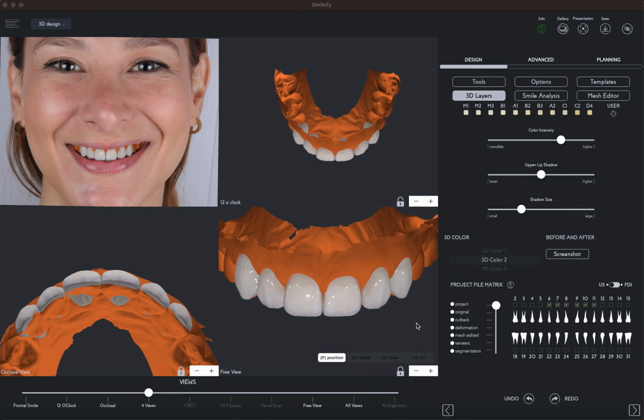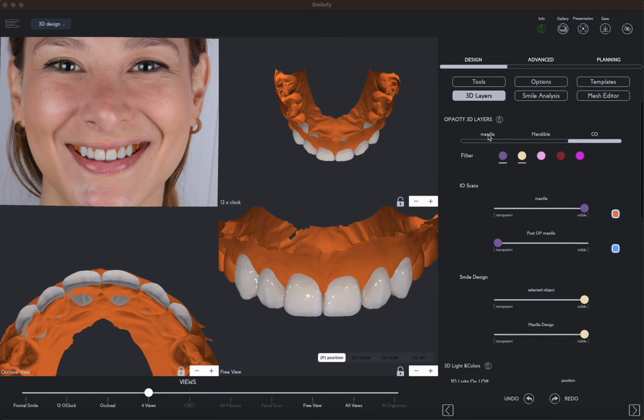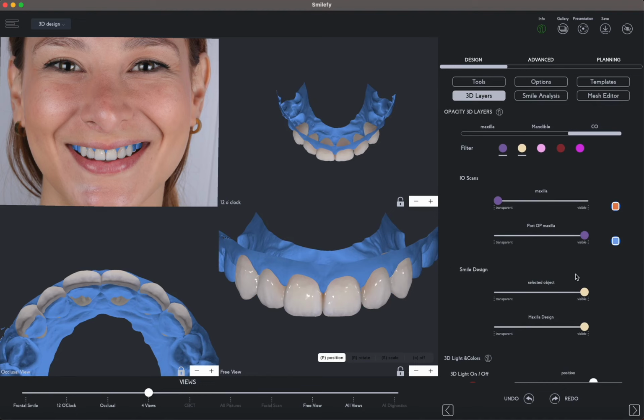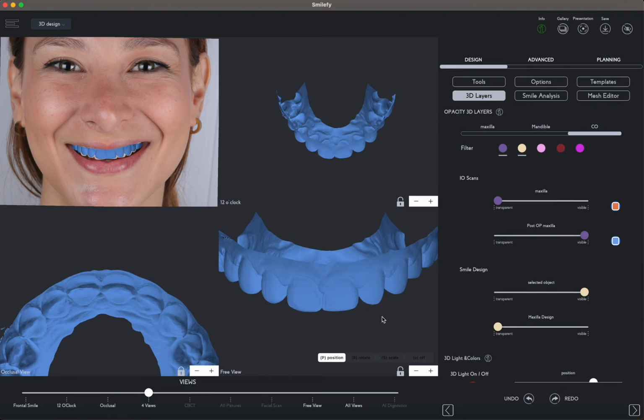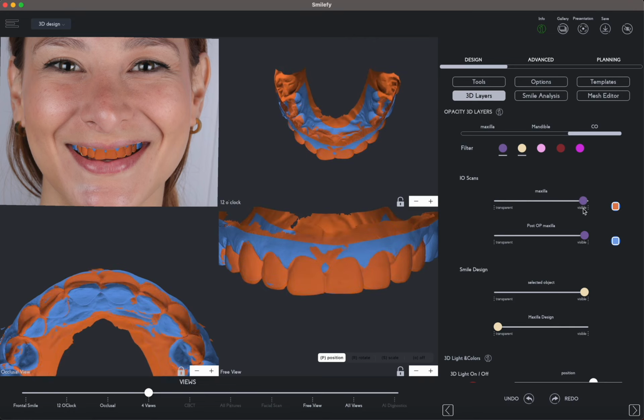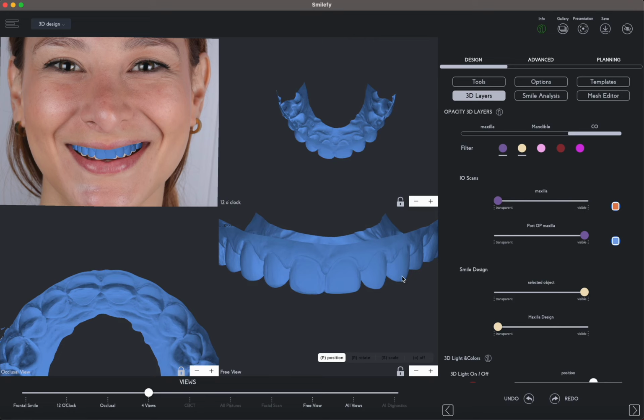In today's video, I'm going to show you the workflow for veneers step by step. First, we do have the design, the mockup. We superimpose the design with the original scan of the patient and with the prep file. These are the prepped teeth.